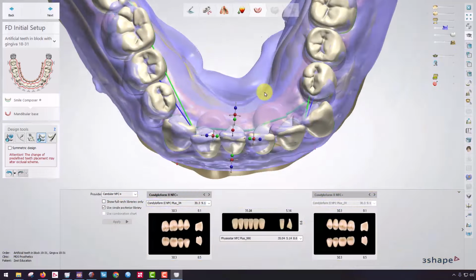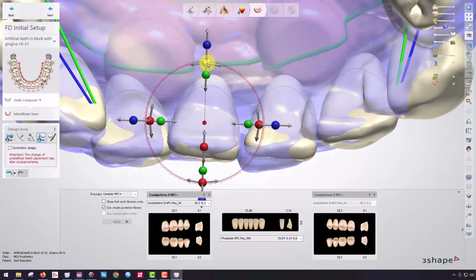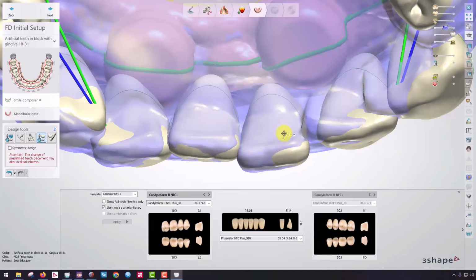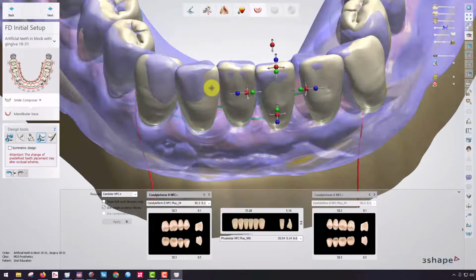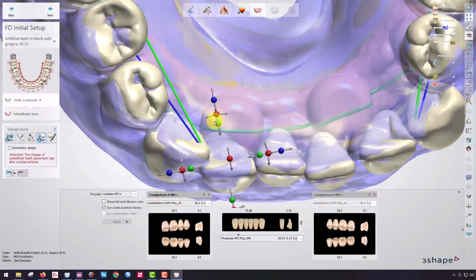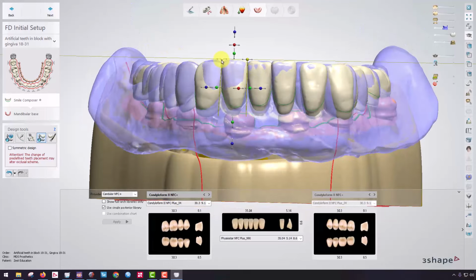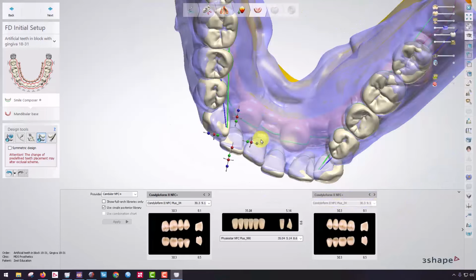But the nice thing about the Candelora library is I have full function to do some pretty unique things here. So what I'm going to do is line these things up approximately to where the arch is, give a little bit of that asymmetry right here, and then, shown right in here, I can click that, rock it just a little bit this way, bring it across here, and then give this a little bit of push and pull, maybe shrink it just a little bit and tilt that way, and then bring it out just a touch.